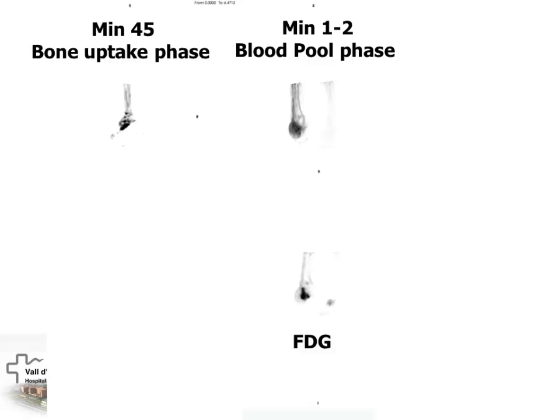And here you have 3 images. This is the fluorine uptake. This is the blood pool phase of the PET just after injecting the fluorine.